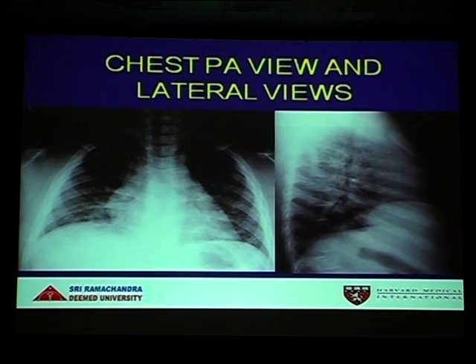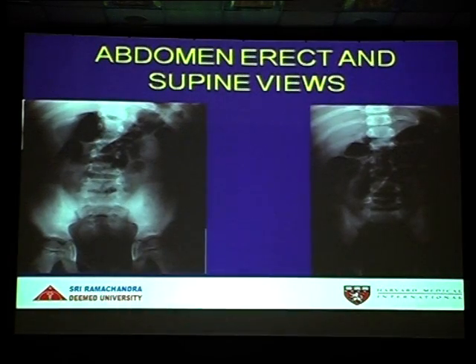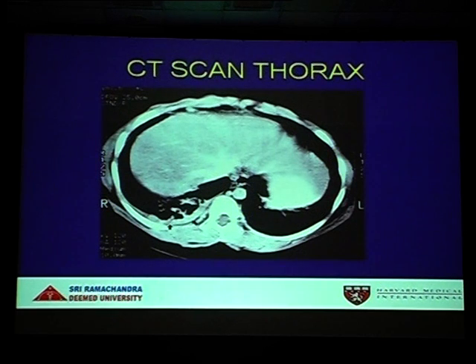Because fever is there, history of sting bite is there, you'll expect some pneumonic changes will be there, but we are not seeing anything in this particular X-ray. Because abdomen pain also was there, for that reason they have taken an abdomen in a supine and also in an erect view, but that also is not contributory. So next modality, they have done a CT thorax.